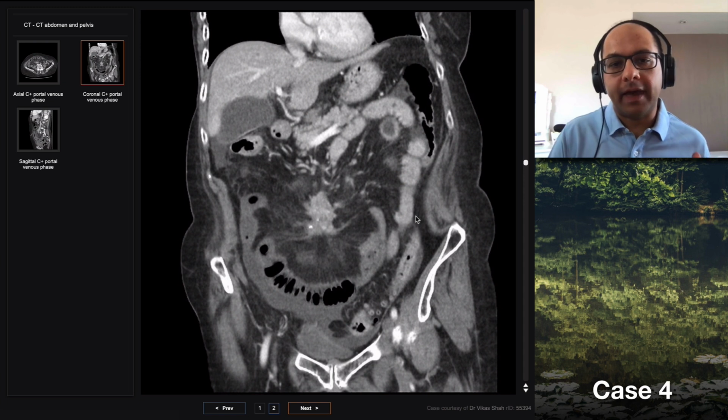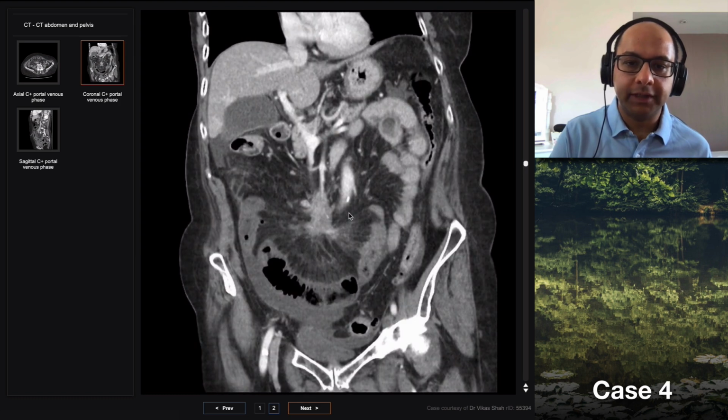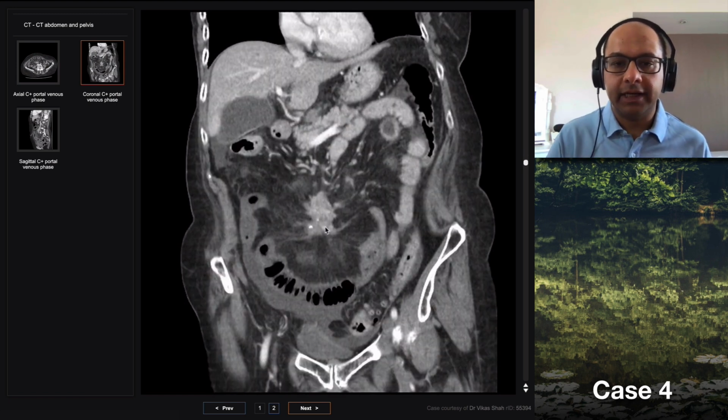So just thinking about what we've done here. You've made a pickup of a mesenteric neuroendocrine mass, which is likely to be a carcinoid type of tumor. And then we've got the consequences of the bowel changes. But if this is a carcinoid, it's a malignant lesion, isn't it? Yeah. So we need staging. So what would you do with regards to that? How would you do that?